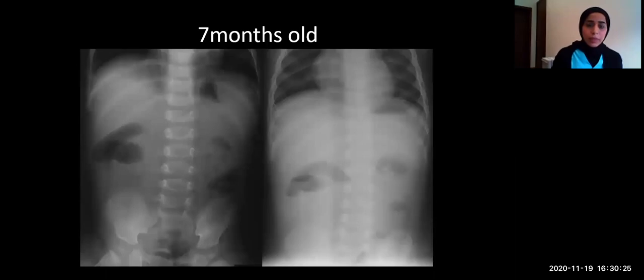In the abdominal radiograph, this is a patient with irritability, colicky pain, and he is 7 months old. If you look at this image, you will not see the ordinary signs of bowel obstruction, which I already commented on previously, the distension and air fluid levels. As you can see here, this is supine and this is erect, evident by the air fluid level here.